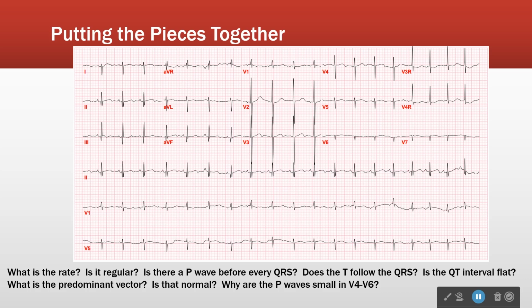What about the vector? Looks like super rare. It's a baby. So yes, their vectors are usually abnormal, just because of the way they haven't grown into it yet. You notice I'm skipping over axis on purpose. It's because axis really isn't very important.